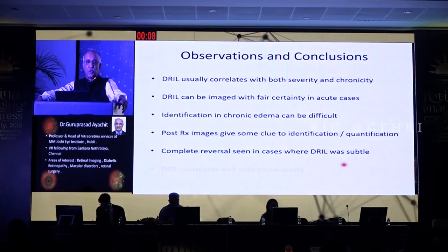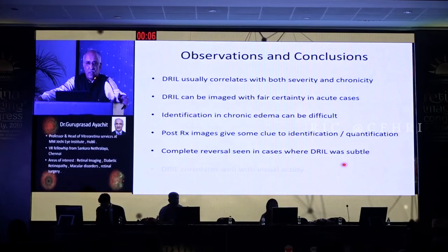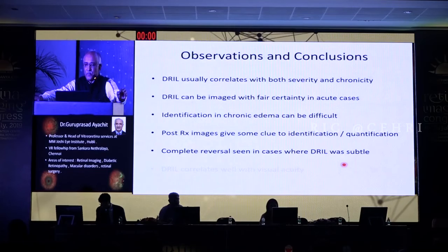So my observations and conclusions from what I have studied in the last 1 year after the last conference: DRIL usually correlates with both severity and chronicity. DRIL can be imaged with fair certainty in acute cases. Identification in chronic edema can be difficult. Post-treatment images can give some clue to identification and quantification, and complete reversal is seen in cases where DRIL was subtle.